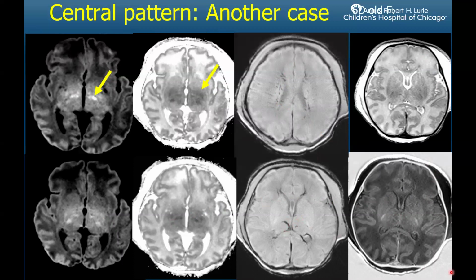And this baby was a severe encephalopathy on that Sarnat grading system. There's also significant seizures, and this baby had meconium aspiration with prolonged resuscitation and respiratory symptoms. So that central pattern, even though there is just a small area of diffusion restriction, it takes it into that severe grading. And what does that mean from a clinical point of view?